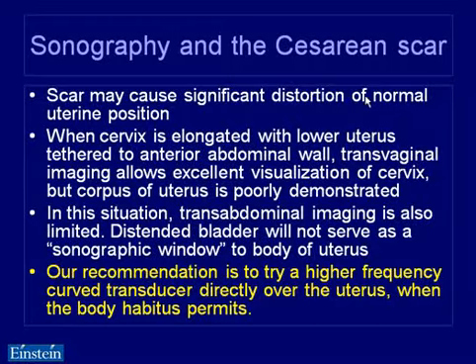The scarring can cause significant distortion of the normal position. The cervix is elongated. There's poor visualization of the body of the uterus. And additionally, transabdominal imaging can be very limited, and there's a poor sonographic window.